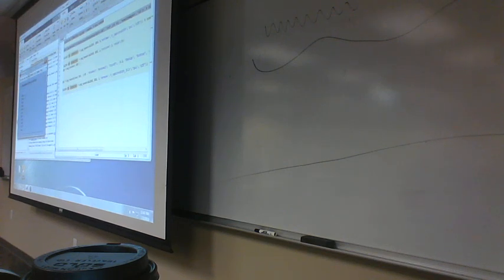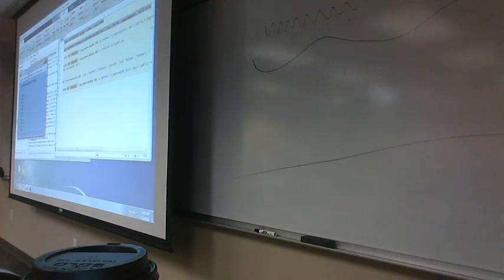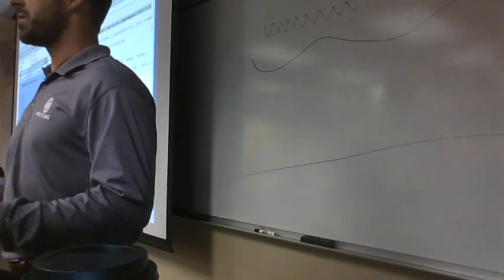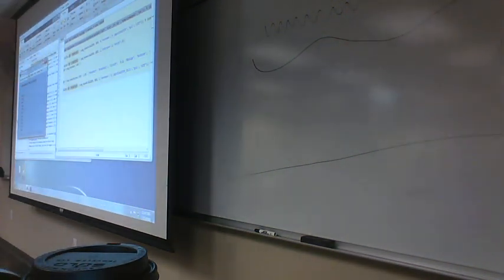And you're going to press that lucky button, enter or OK or whatever it is, where all the magic happens. And it'll think, probably not very long, and it'll bring up that other prompt again that's going to ask you if you want to save this file, and it should put a suffix on our file that says resam or something like that. Yeah, no? 256.